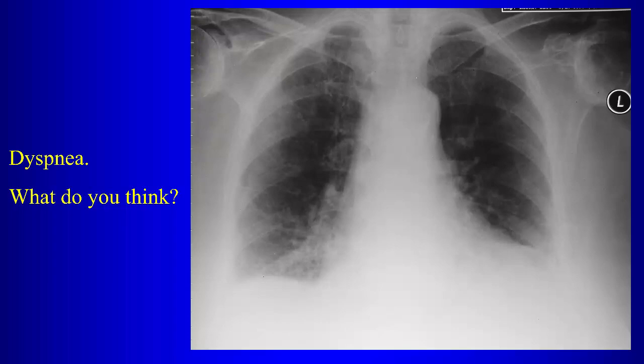Well, of course, the game is chronic eosinophilic pneumonia. Does that give you reticular opacity? What do we look for in chronic eosinophilic pneumonia? We look for peripheral consolidation. Peripheral airspace opacities for chronic eosinophilic pneumonia. So we're playing the game of what's the other finding, right? What's the other finding on the chest radiograph?